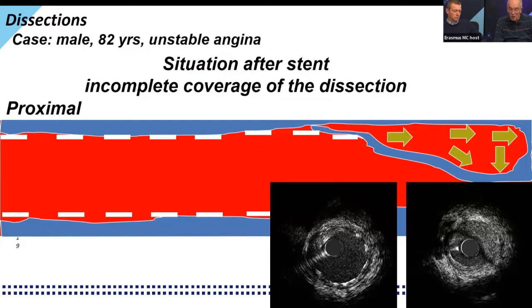And that means also after pre-dilatation, because then you can appreciate the extent of an eventual hematoma, so you can adjust your stent length and the placement of that, and then you avoid this kind of situation. If you're not careful, it's possible that even by placing new stents, you move the hematoma further distal until there is a point of no return.